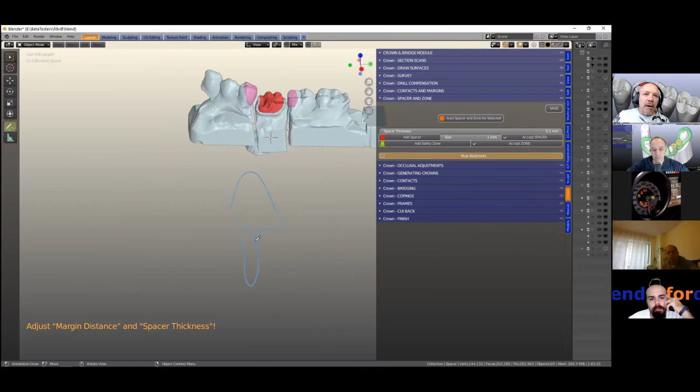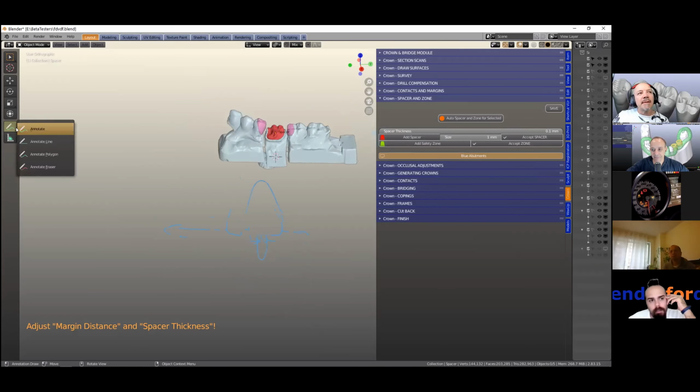Now ideally, say the margin comes around like that. Ideally, this we want to scale outwards, but this we want to scale inwards. It would become a huge mess. That's my personal opinion about that, but I don't know how else we can do it. But for crowns, easy. I don't think that's a problem at all.